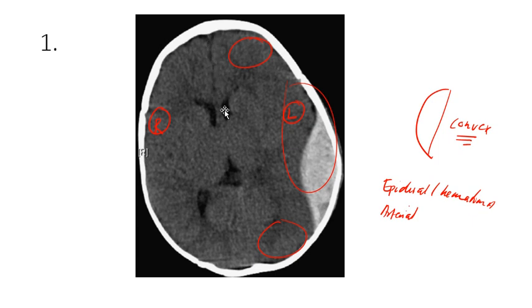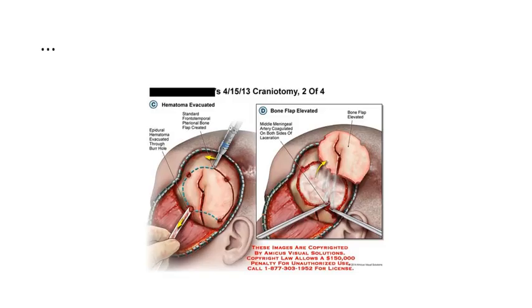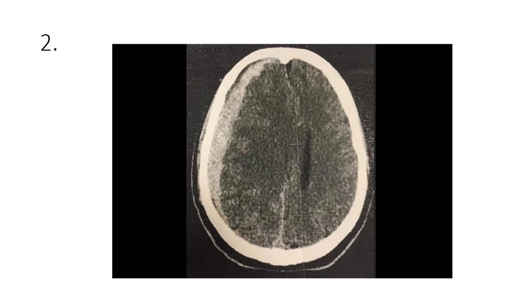And you can see obviously that there's a midline shift. That line is supposed to be nicely in the middle, but you're seeing that there's a midline shift, and those are all features. And there is effacement. Effacement means loss of the ventricles, mainly on the left that you're seeing here. Again, you can see there are no sulci and gyri that you appreciate here, with cerebral edema associated, which we'll look at very soon. And so this is an epidural hematoma, and this patient needs emergency evacuation of that clot, so you do an emergency craniotomy. So that's very, very important to know.